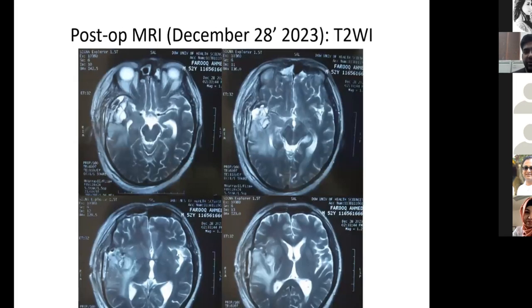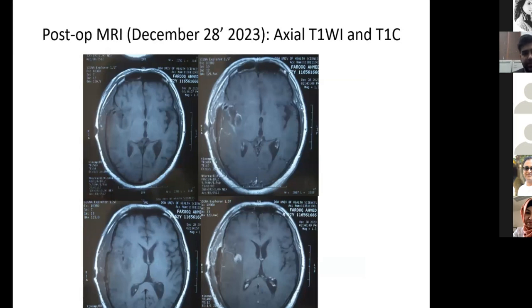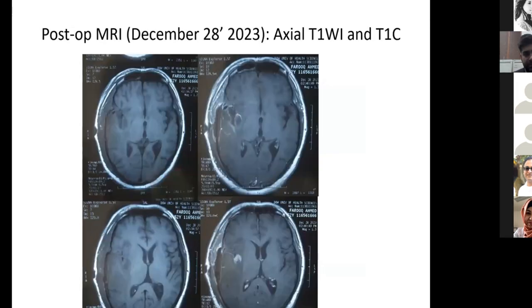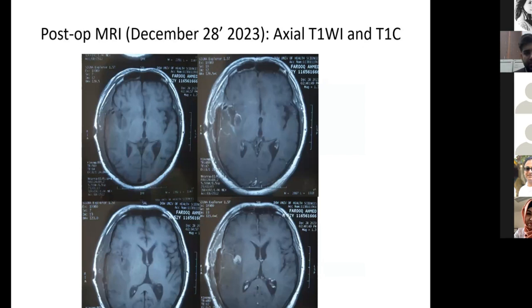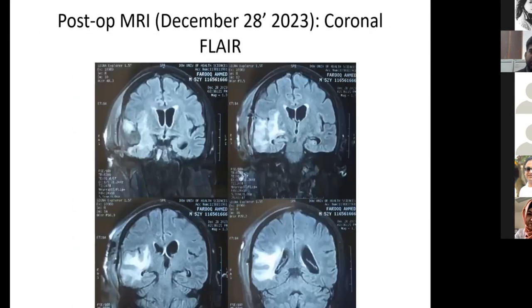Right. Dr. Shayan. We have very limited images over here, very few axial images. As compared to the T1 weighted sequence, there is no intrinsic hyperintensity to suggest hemorrhage, post surgical hemorrhage. So probably this enhancement is definitely some residual tumor, which is appearing bright. Had it been blood products, then it would have been bright on T1 as well. So that is favoring that.